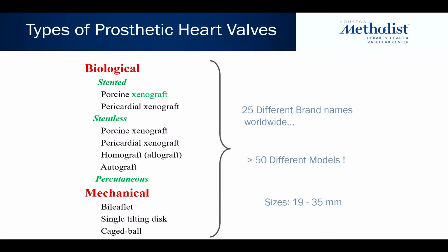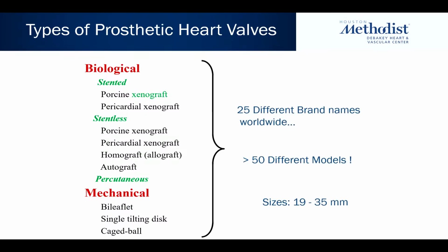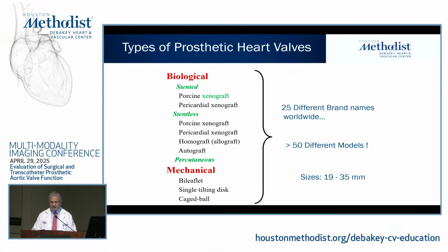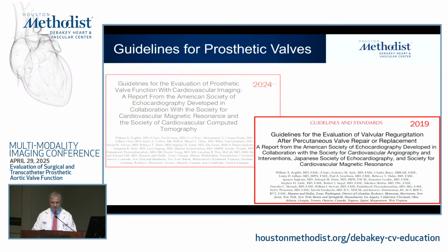This is the complexity of these situations, which tells us that as a sonographer or a clinician taking care of these patients, you would really like to identify what type of prosthesis these individuals have, in addition to what the size of the prosthesis is, because it's really very important.